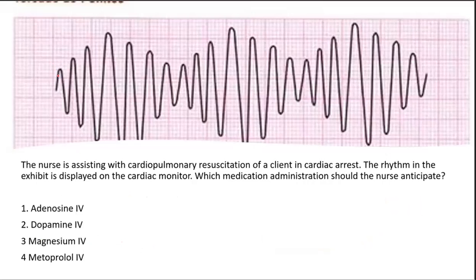Okay, once I see this, it just reminds me of M. I can write an M over this. What we call Torsades de pointes, the twisting of the points, is a kind of ventricular tachycardia. But the ones we saw previously were having the same shape. So those ones, we call them monomorphic ventricular tachycardia. Mono means one, morphic means shape.